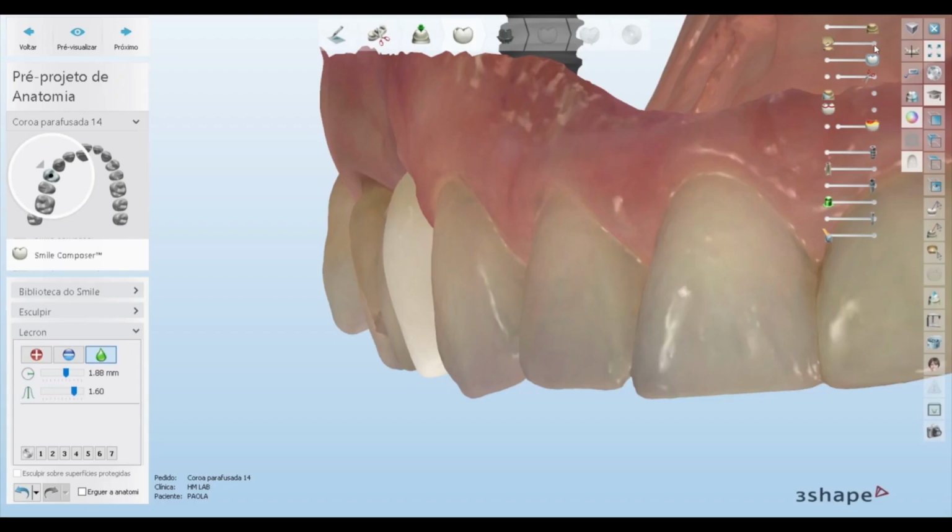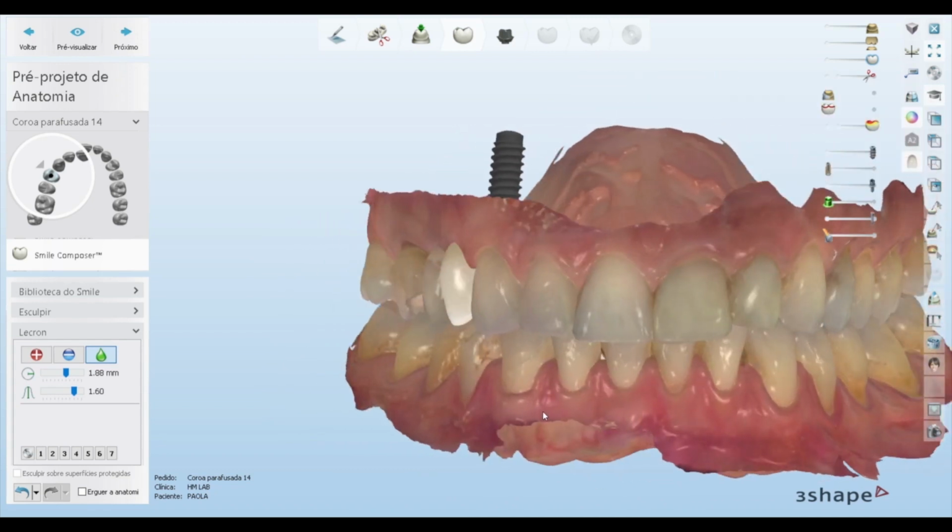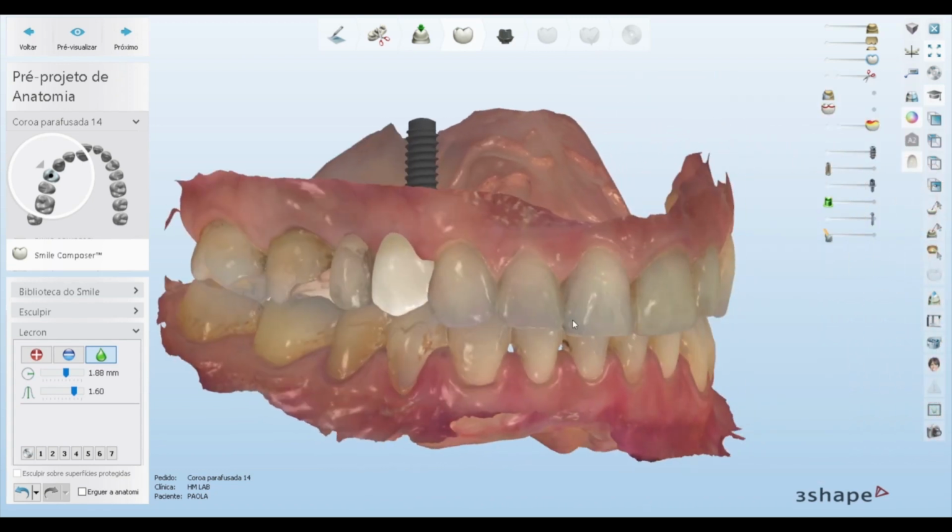Digital impressions can be sent to a lab or remain in the scanning system for an in-house fabrication of the final rehabilitation. We have the ability to use technology to design and manufacture the corresponding restorative components. Custom abutments are designed digitally and milled out of the material of our choice. These digital design and manufacturing methods have gained popularity.